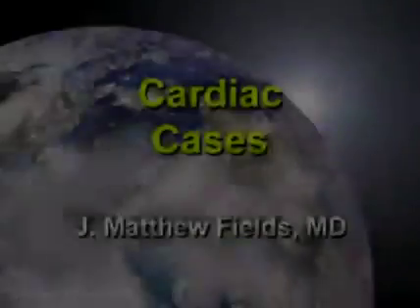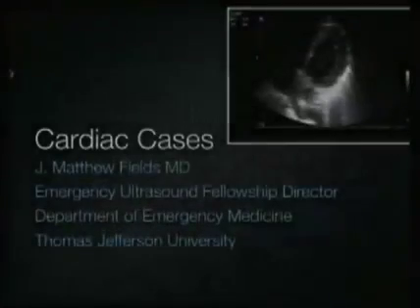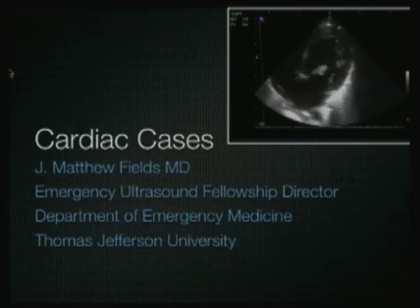This lecture is going to be on some cardiac cases that will help reinforce some of the principles talked about in the cardiac and IVC lectures. We are going to discuss some cardiac cases to help reinforce some of the principles of cardiac ultrasound.